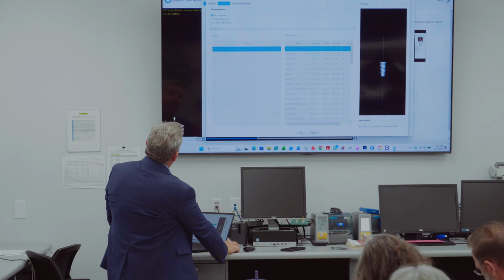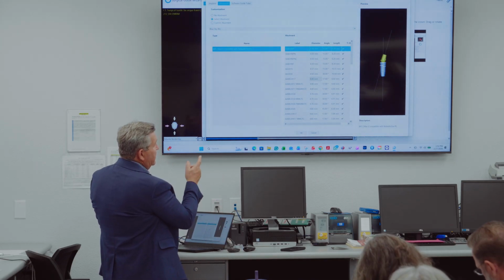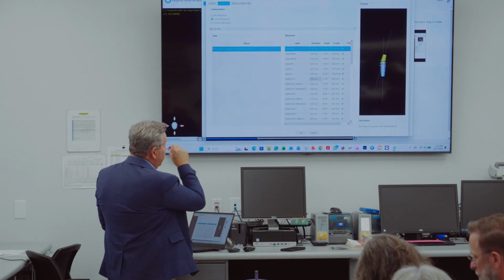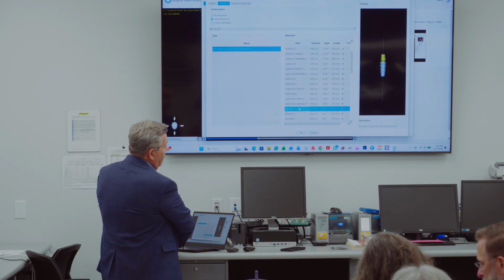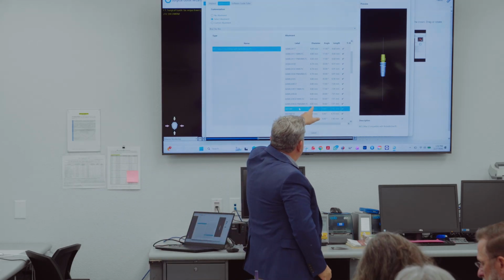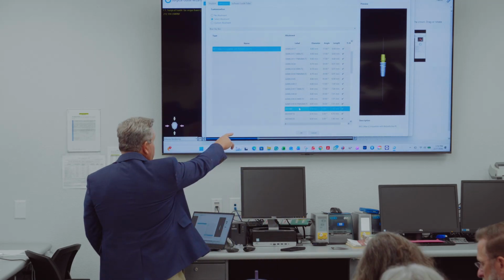And we're going to go select abutment, and all these different abutments that Blue Sky Bio has available for its implants are here, okay? And if there are compatible Blue Sky Bio abutments in the system for other implants, it'll show them here, but normally their own abutments are going to be in here. I'd like you to choose, just for this exercise, a straight 4.5 abutment, just like that, okay? So there's no angle on this one. See how they have a 30 degree, 17 degree, 45 degree? Just choose a 0 degree 4.5.